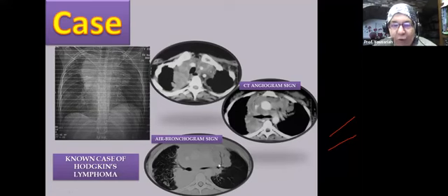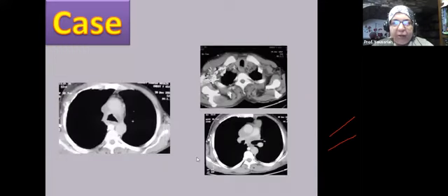Now, we see air bronchogram bilaterally. Bronchi are present in the lungs. Okay, so seeing air bronchogram means that the abnormal tissue around them is lung tissue. So this means there is bilateral extension into the lungs. This is the importance of air bronchogram sign here.